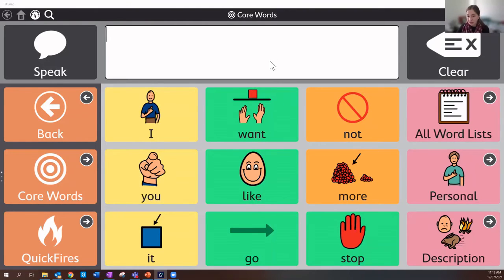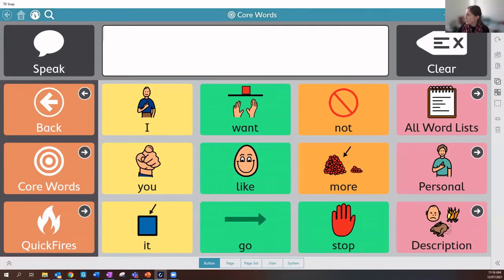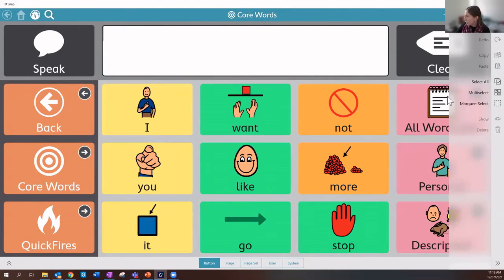But I'll just demonstrate some of those things that I just talked about in the slides so you can get a bit of an idea of how that works. Up the very top right-hand corner, you can see a little cog with a pencil through it. That's the settings button. You click on that and that basically takes you into edit mode. You can see that you're in edit mode because there's a blue bar that runs across the top. You can also see the sidebar here as well. You can expand these with the arrows out just to show you what each button means.